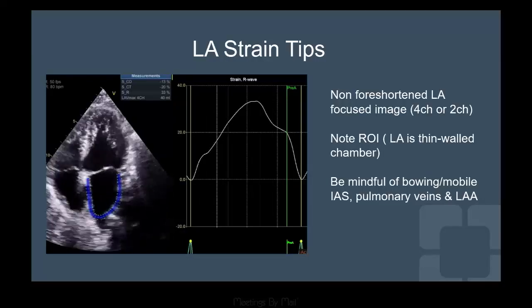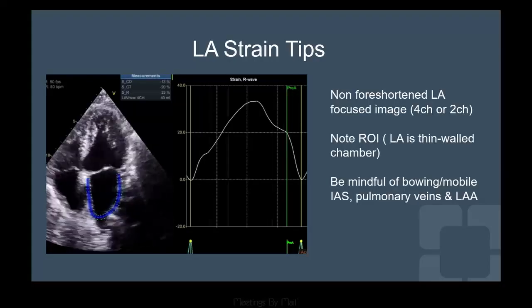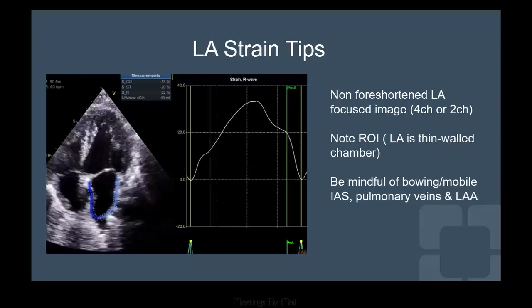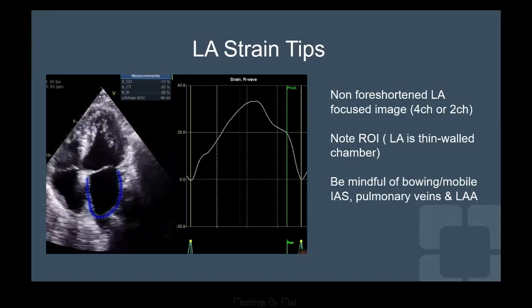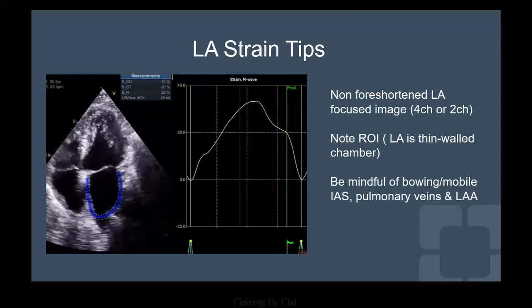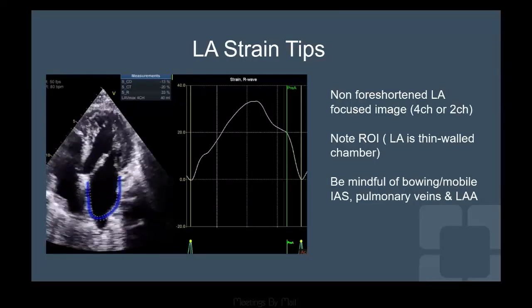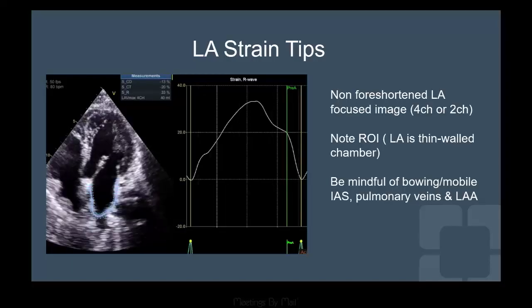do not overcorrect. A lot of people try to go and overcorrect or stretch, unless of course it's not tracking correctly. The reason is there is an inherent bias you introduce when you're trying to change, and you don't want to change too much. So let it track, and if you're satisfied and it's on the wall, doing well, just leave it, because then you'll have a standardized way you're measuring it across all your patients.